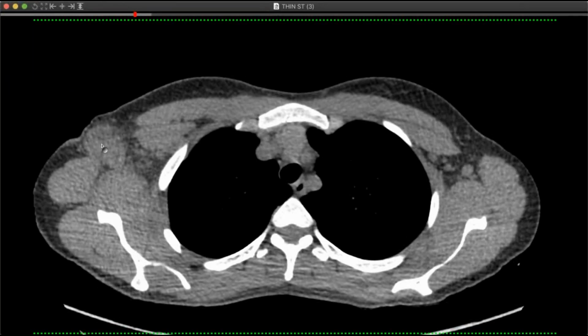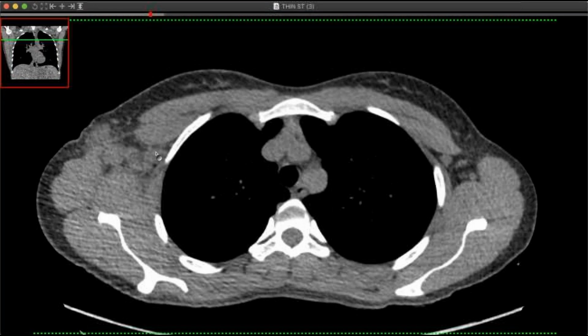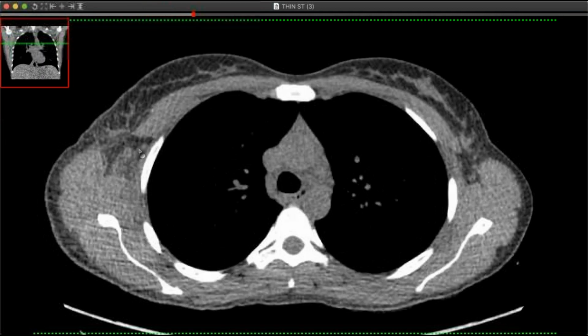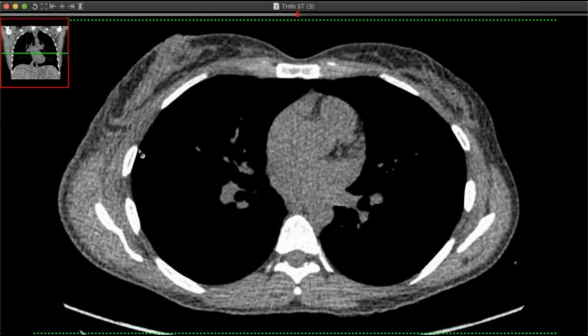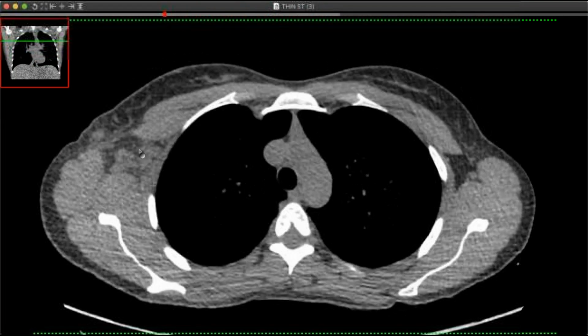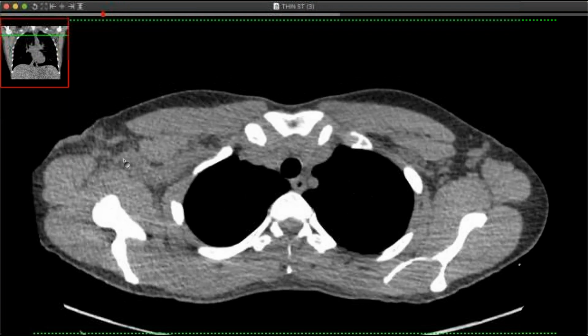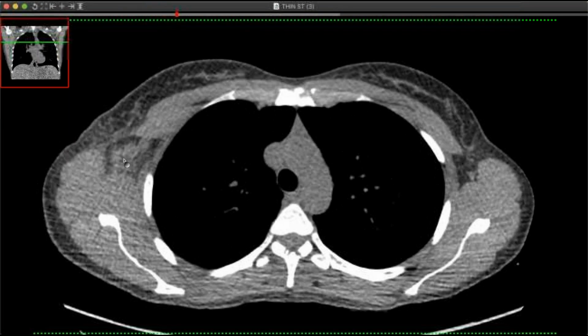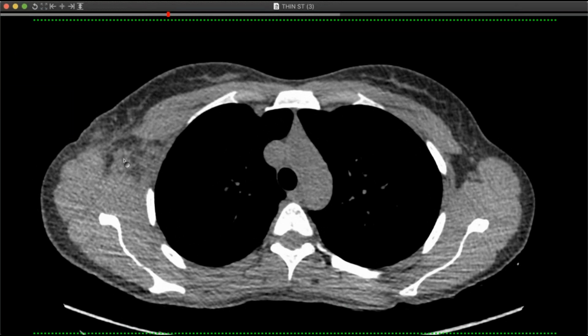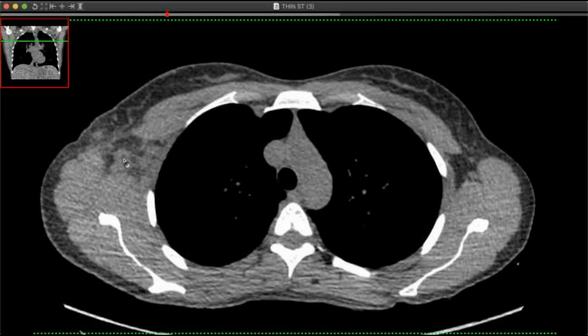All right, you can see there are these axillary lymph nodes, and they're nice and round. They're a little bit low attenuation in the middle, but nothing else. No mass in the chest wall. Nothing like that. Given her presentation, it's probably just an infectious lymphadenitis. Her history was spider bite or something like that, so you would think about maybe something else, like cat scratch disease.